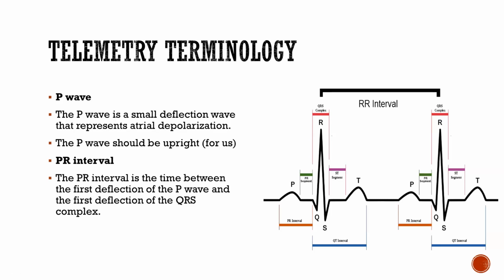So this portion is what we're basically going to call the toolbox, and we're going to go over the pieces of the PQRST and what they are and what they should be. It's going to be repetitive. I apologize in advance, but I need you to understand what is going on.